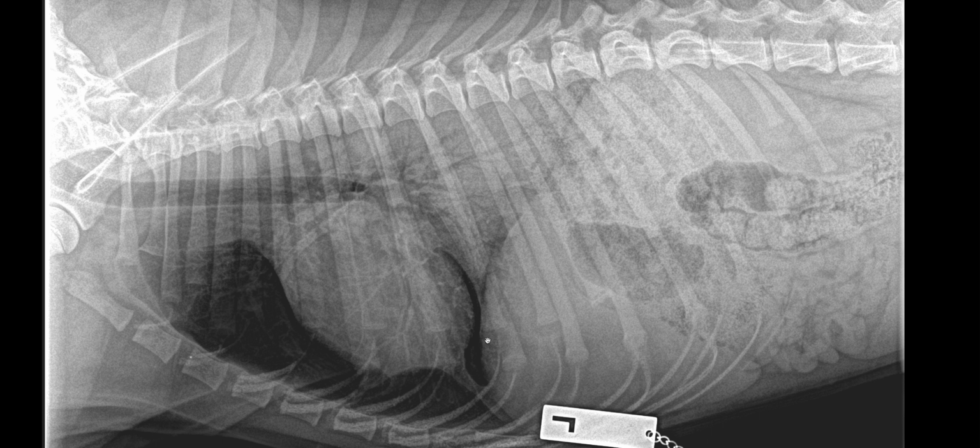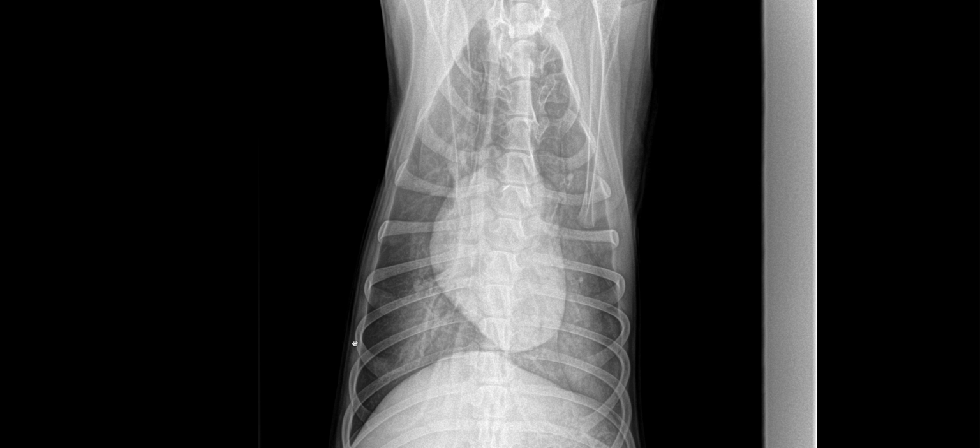This can be due to the fact that either the cardiac silhouette is really a bit small, or that there is some collapse of the middle and cranial lung lobes when the dog is positioned on lateral recumbency, and that makes the heart flip a bit away from the sternum, and this can be seen in some deep-chested dogs as a normal variation. There are indeed no signs of pneumothorax on that ventrodorsal view, which is something that could also explain a dorsal elevation of the cardiac silhouette from the sternum on the lateral views.